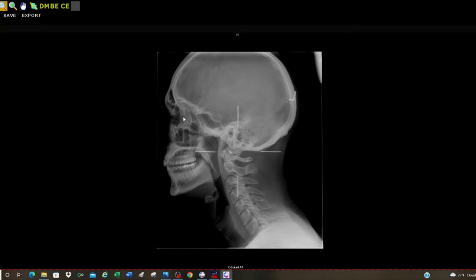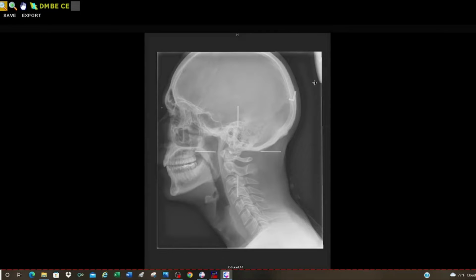So, here we are looking at the lateral cervical x-ray on this patient. This is going to be our basic analysis. We start with the lateral cervical x-ray to look for any basic pathology. So first, let's get situated. This is the head as a whole. This is the skull. This is where your brain sits. This is your eye right here, both eyes technically. Your nose is right here where the cursor is. If I lighten this up, you can see the nose right there. I'm going to keep it dark for right now.